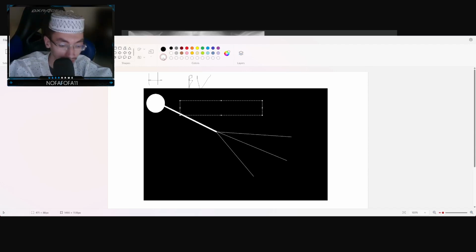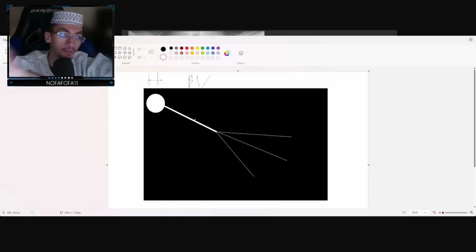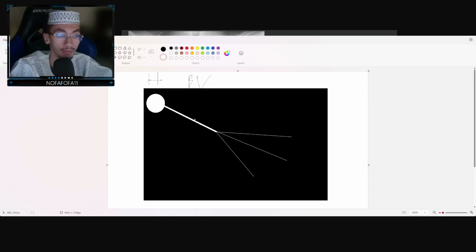This one right here. Now this blood vessel will spread out, and when it spreads out, it becomes thinner and thinner, because when the blood vessel spreads out peripherally towards the chest wall, it becomes thinner. So this is the blood vessel, but now it becomes thinner and less visible.